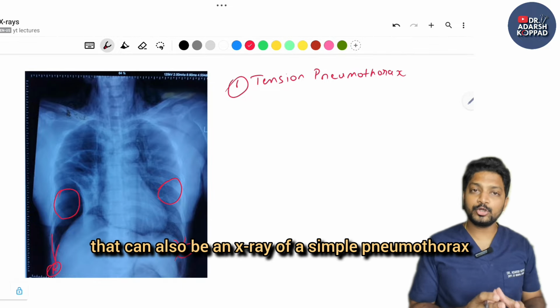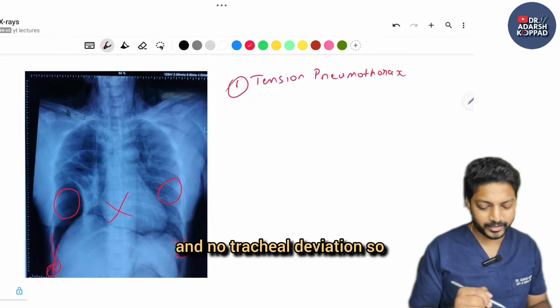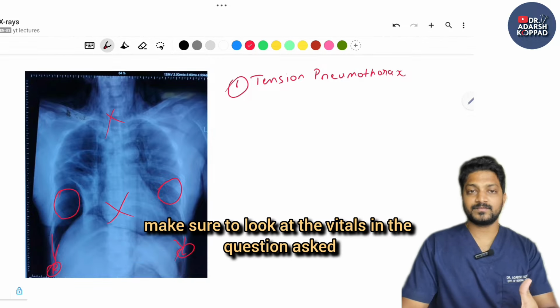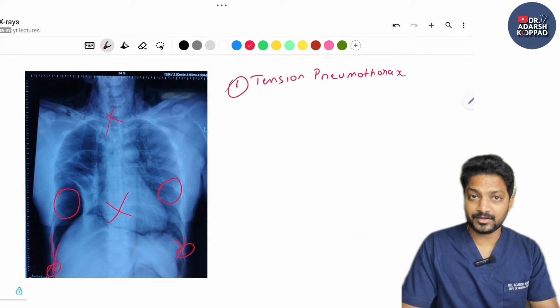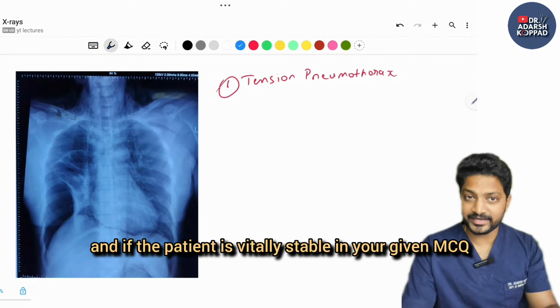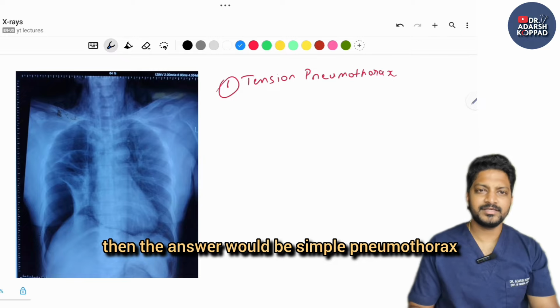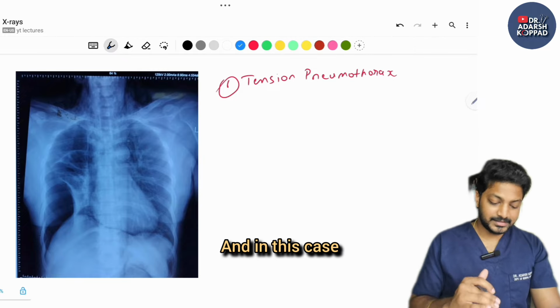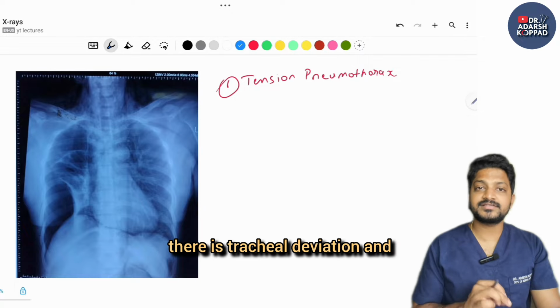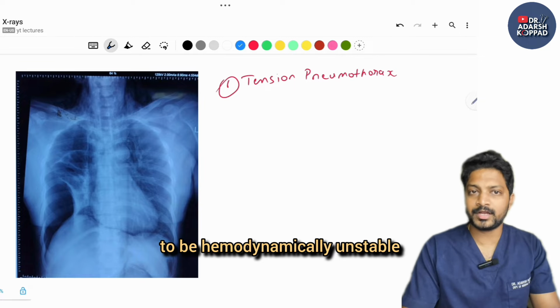So these are the points I want you to make a note of when you see an X-ray of a pneumothorax. There can also be an X-ray of a simple pneumothorax if there is no mediastinal shift and no tracheal deviation. So make sure to look at the vitals in the question asked. If there is no mediastinal shift and if the patient is vitally stable in your given MCQ, then the answer would be simple pneumothorax. And in this case, there is mediastinal shift, there's tracheal deviation, and in the question also you can expect the patient to be hemodynamically unstable.